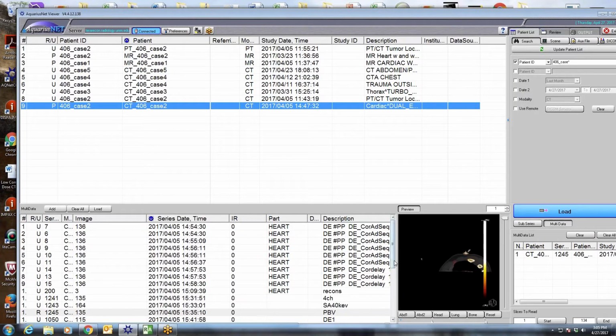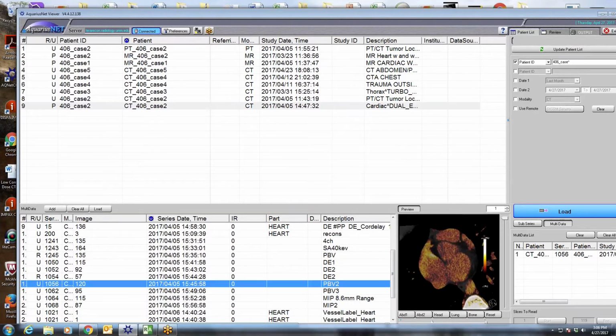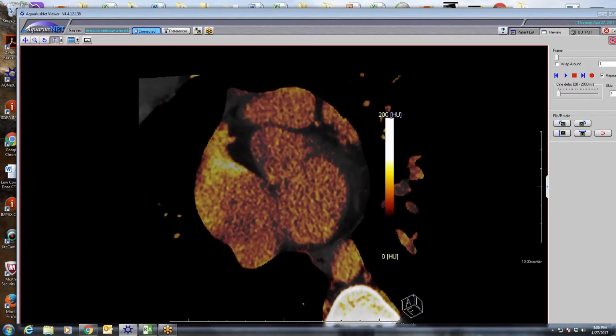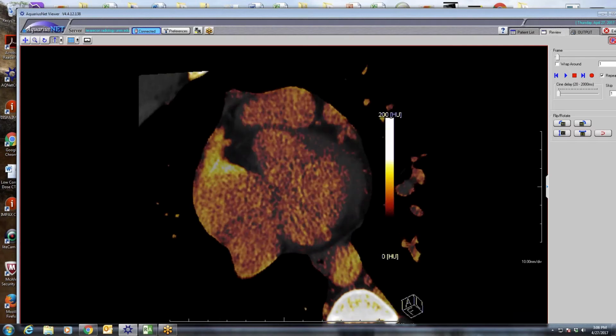And then again, I just showed the delay, and then using some tricks, we kind of nulled the myocardium, if you would say. If this will work, scroll through it. Oh, my Lord. Okay.